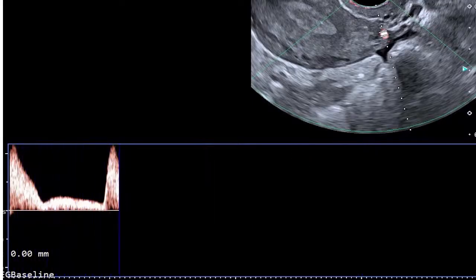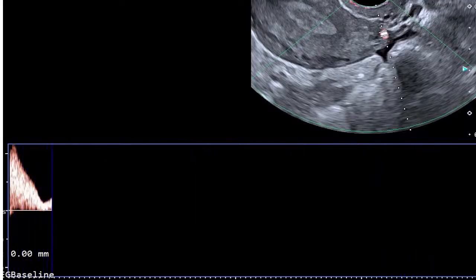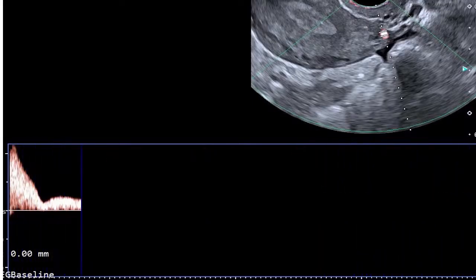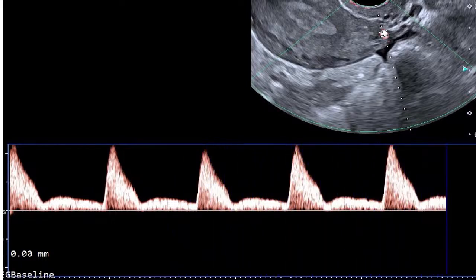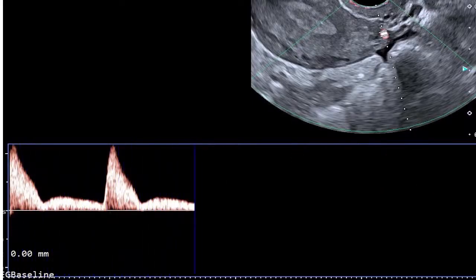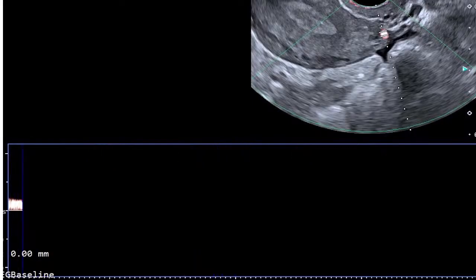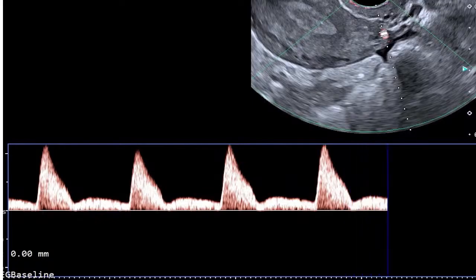The uterine artery Doppler gives us a window into endometrial perfusion, helping identify blood flow patterns that may influence implantation and infertility. While Doppler findings alone cannot predict pregnancy, they can provide valuable information about uterine vascular resistance and complement the overall fertility assessment. Now I need you to understand the pulsatility index and Doppler waveforms, and discuss how these findings fit into modern fertility evaluation. If you can understand the science behind endometrial receptivity and uterine blood flow, you are in the right place.